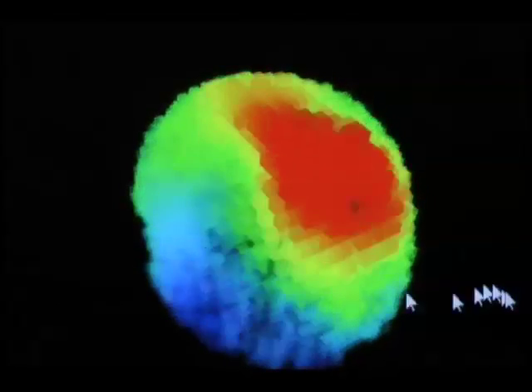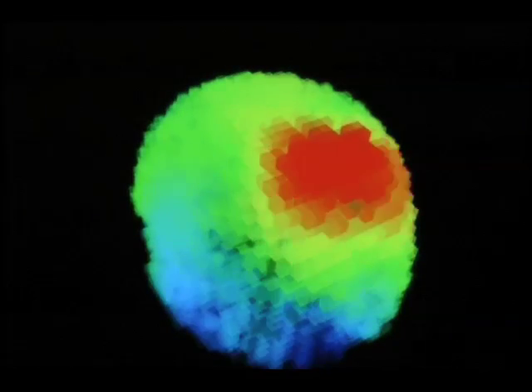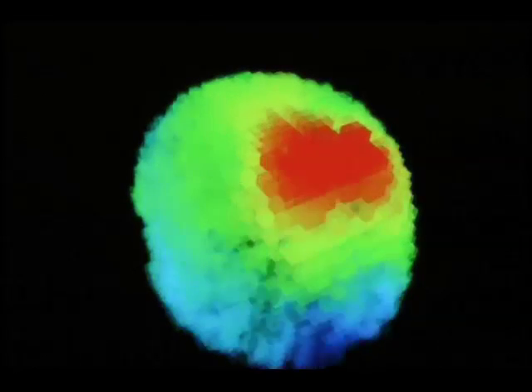And we can rotate this brain to see where there might be other activity. We see relatively little in the front specifically. So that shows the basic ability to choose different components to view and image in real time.